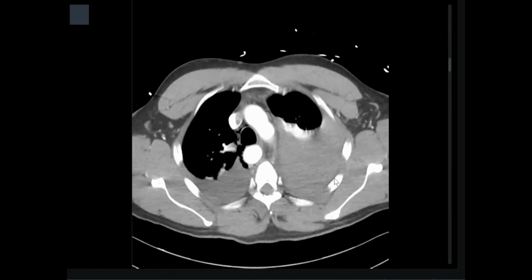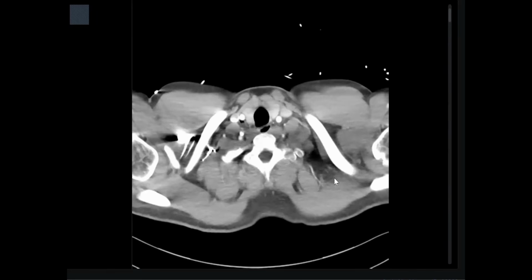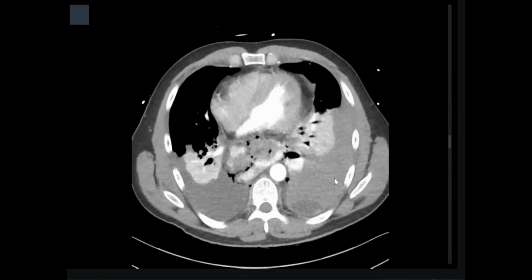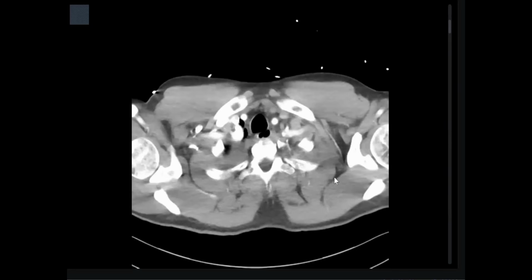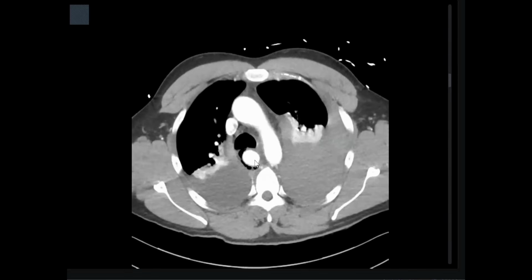I would urgently contact the referring clinicians and inform them that this patient would need urgent attention of upper GI surgeons and likely surgical intervention. Good, my friend. We have here, okay, give me the mouse, give me the control. Yes, I will take it back. Thank you. It's a clear case.